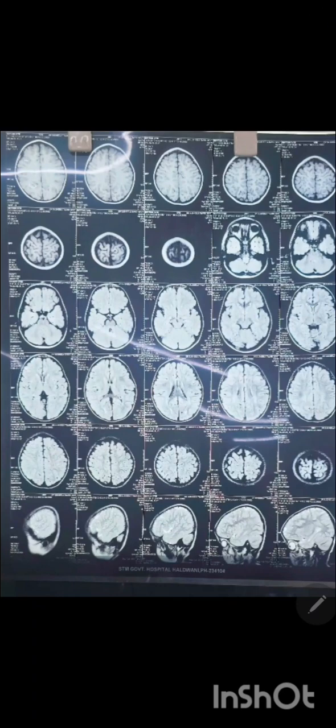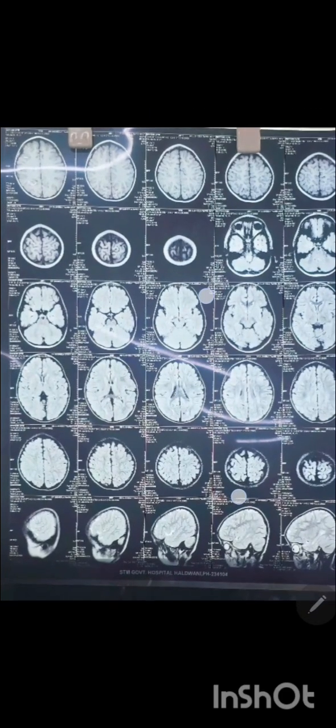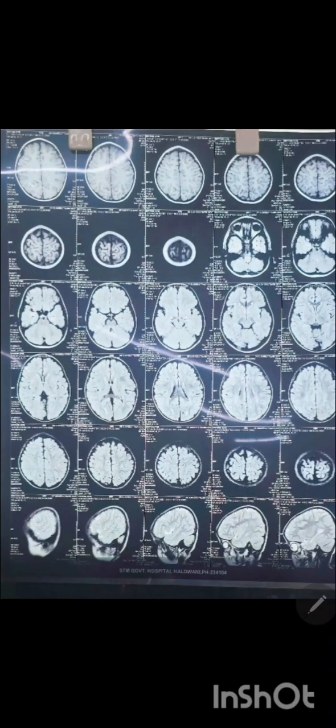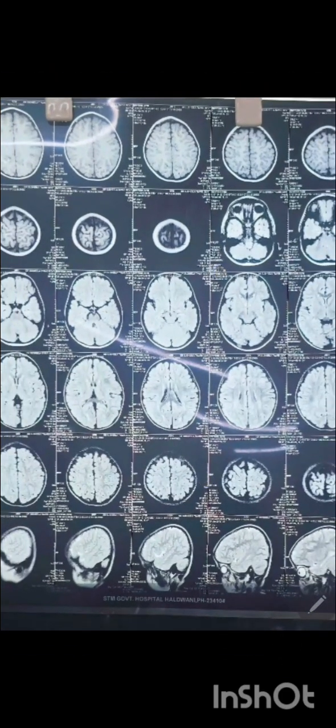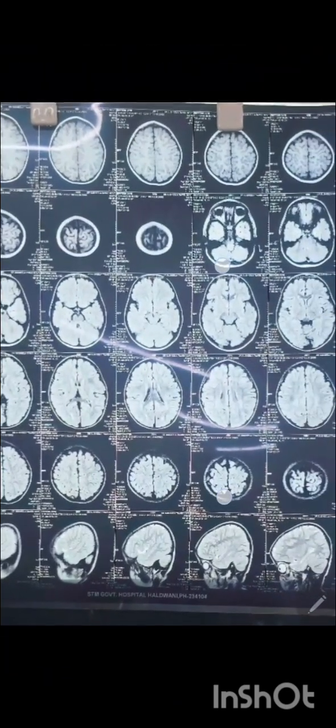The MRI is somewhat more complex in comparison to the CT, and there are many factors that lead to production of the final MRI image. Different combinations of these will be used for different clinical presentations. Some examples of common images and sequences: we can differentiate the MRI on the basis of T1 weighted and T2 weighted imaging.